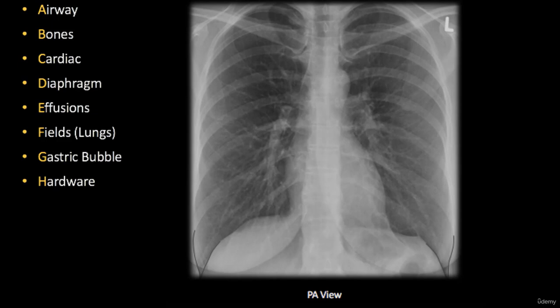Sometimes we can see a level of fluid in this costodiaphragmatic recess, and we call it effusion because we don't know what exactly this fluid is. We're going to make the next step then and aspirate some fluid out for biochemical examination to make the precise diagnosis and to figure out if it is blood or pus or lymph or just interstitial fluid. So normally the angles are empty.